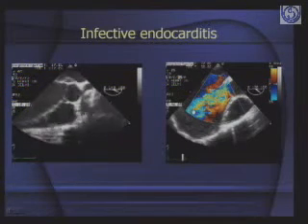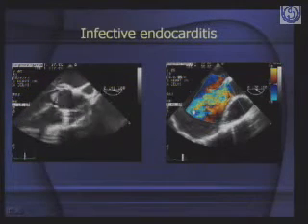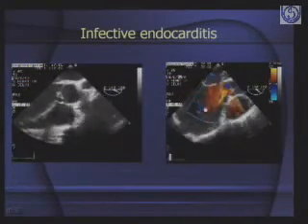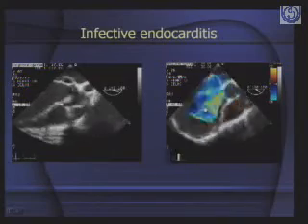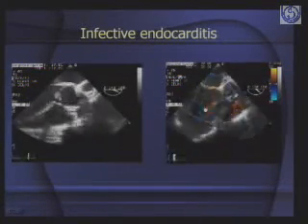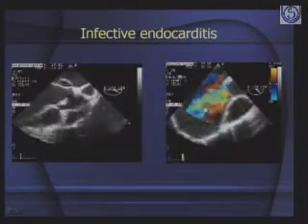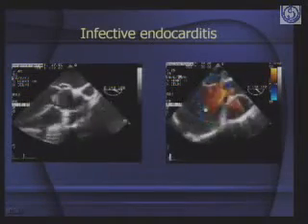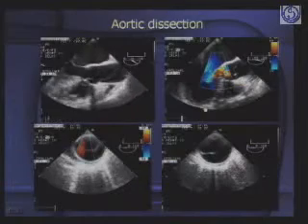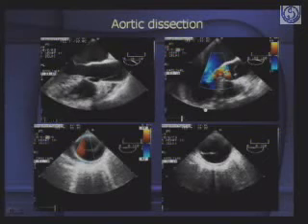Now you don't need to do transesophageal for every case of infective endocarditis. This is just to show that yes, one of the common etiologies for aortic regurgitation is infective endocarditis, and once infective endocarditis sets in, there is a very rapid downhill course. Sometimes infective endocarditis on a bicuspid aortic valve can give rise to acute aortic regurgitation, and the dynamics of this condition are then very different from chronic aortic regurgitation, as we have been discussing. Another common but a very ominous condition is dissection of aorta.